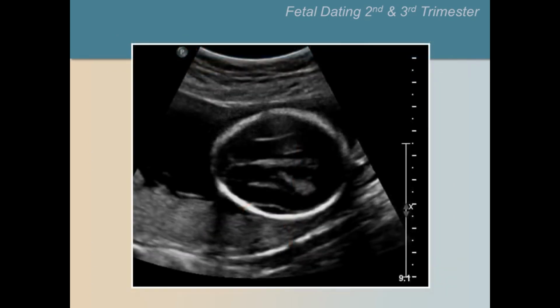Can this image be used to measure the BPD? Please pause the video now to discuss within your group.